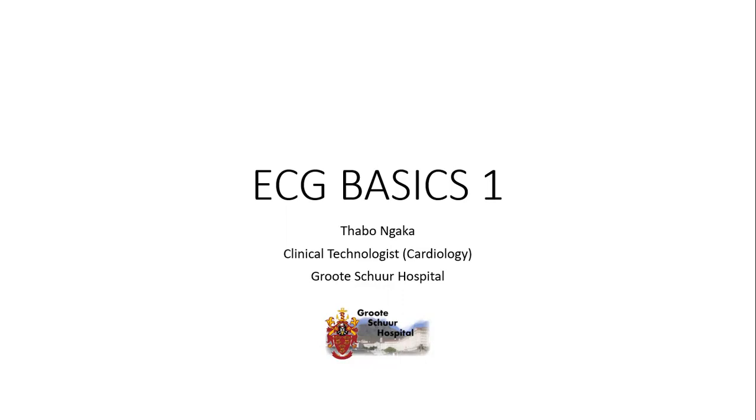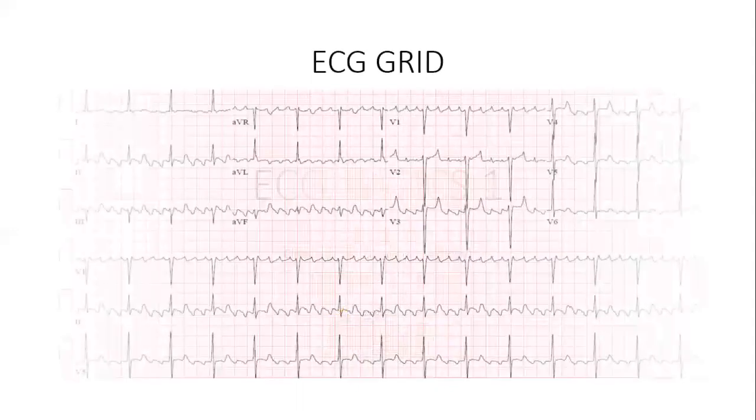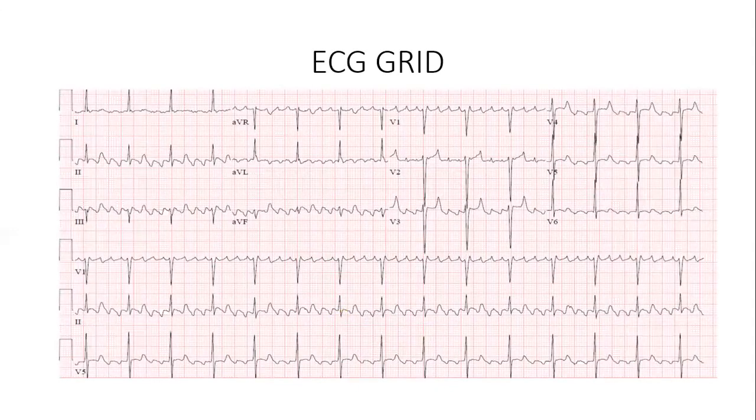This is our first ever ECG Basics session. I'm going to try and keep my videos a bit shorter this time. As you can see, it's labeled ECG Basics 1, simply because there's going to be quite a series of these before we get to the hardcore stuff, before we get to ECG case studies, okay? So without wasting any time, let's have a look at the ECG grid.